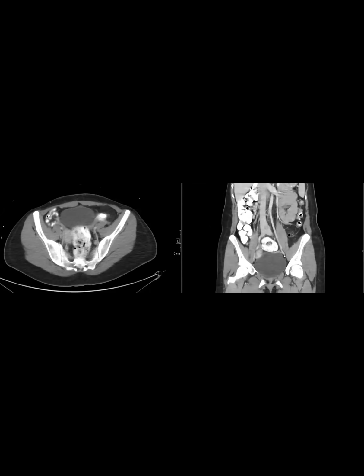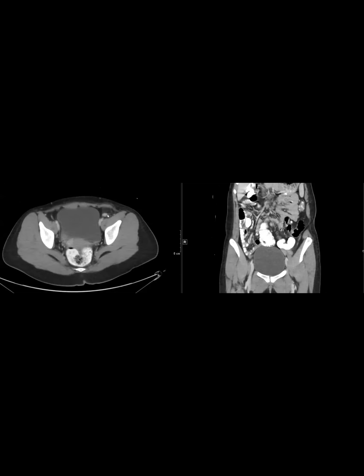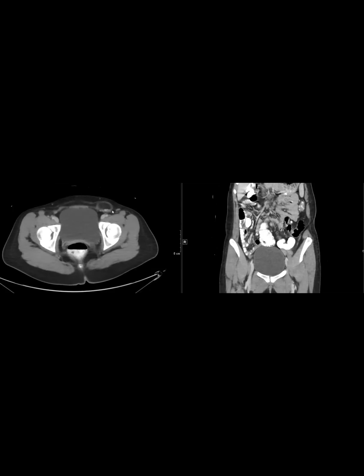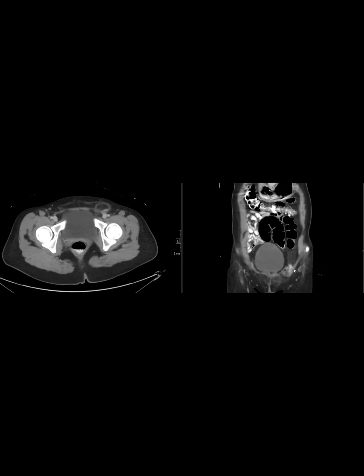Yeah. Victoria, can you go through the axial one more time? You can see here's the uterus, right? And as you go down, this is the ovary, and as you're coming down, you see something that comes down into the hernia sac. The only thing that's bothering me is that fat next to it. It almost looks a little dirty and a little mass-like. It was just hernia, but it may be a little, what do you call it, inflamed or a strangulation of the fat. But that's what it was.